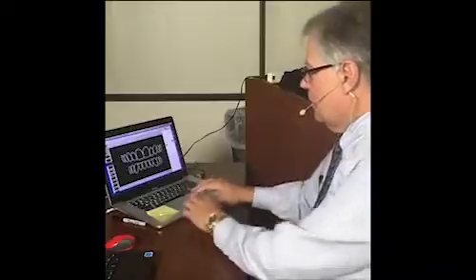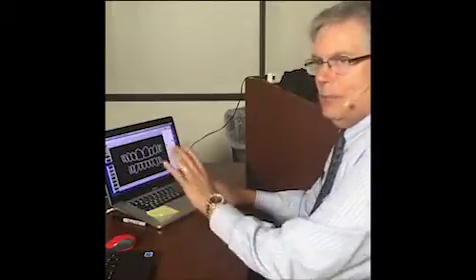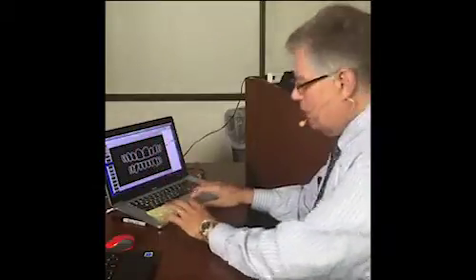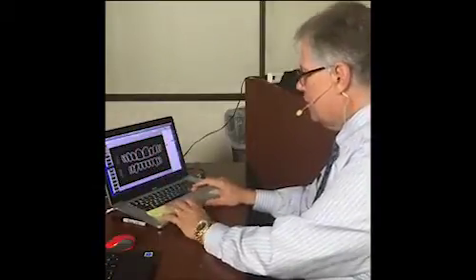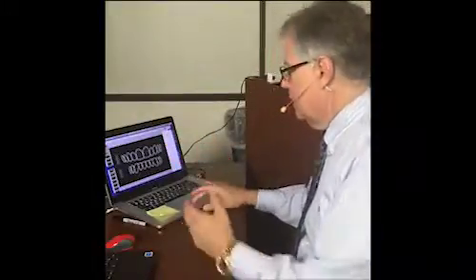And then several years ago, what I learned was that with these, if you're clicking the shape, you have to click the line, and it can be kind of a pain trying to move things. So I actually put together a set that is partly filled. So these you can click anywhere. I've included a couple implants, because as part of the process, you might pop an implant in. Say, I think I want to do an implant there. Now remember, this isn't about precision. This is about thought.